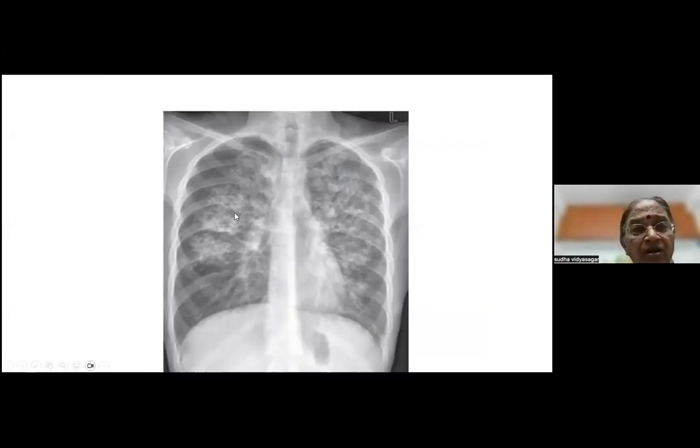This is not pulmonary edema. Okay, fine. So reticular nodular shadowing, okay, on both sides of the lung, correct. And somebody called this a pneumothorax, which is also right. There's a small pneumothorax, and there is one more pneumothorax on this side. Okay, it's a bilateral pneumothorax. You can see the edge here, not touching that. Why is this reticular nodular shadowing not touching the edge of the rib cage? So there is one more pneumothorax here. So it's a bilateral reticular nodular shadowing with bilateral small pneumothorax. Could be an ILD, something like that, which ruptured, and then you got a pneumothorax on either side. Okay, fine, right.